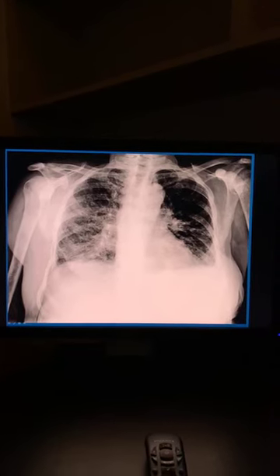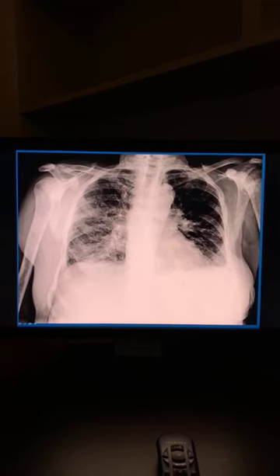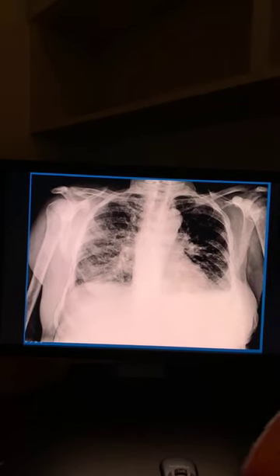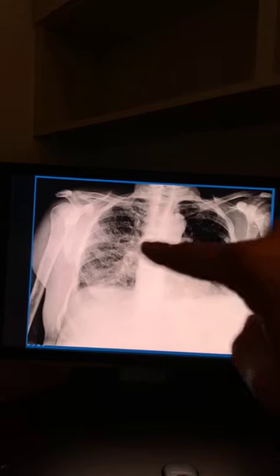This patient had infiltrating breast cancer, and there was a CT afterwards that the patient got. There was lymphangitic spread of the cancer into the lungs, and the breast was completely shrunken down. This is all metastatic disease, all mets throughout the bones, everything.